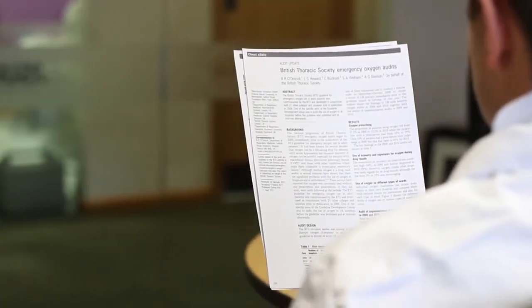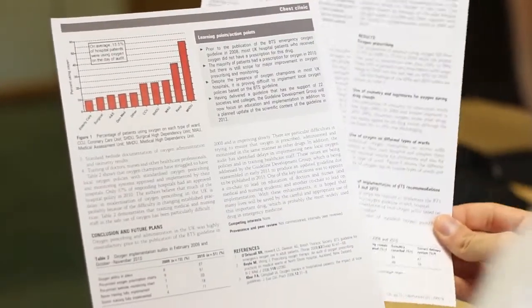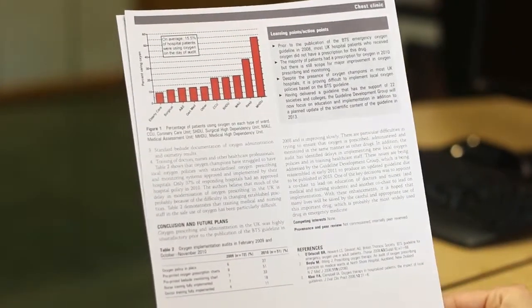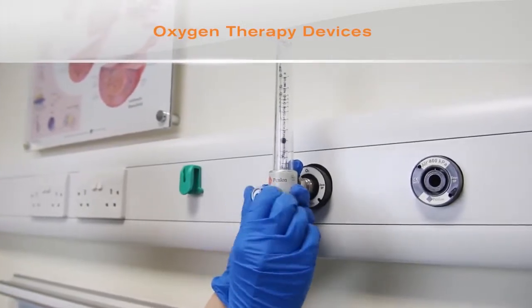Recent papers have shown that amongst practicing trainee doctors and nurses, there is a lack of knowledge about oxygen therapy devices and their correct use. There are also many false beliefs, with the result that many patients on general wards are incorrectly treated.